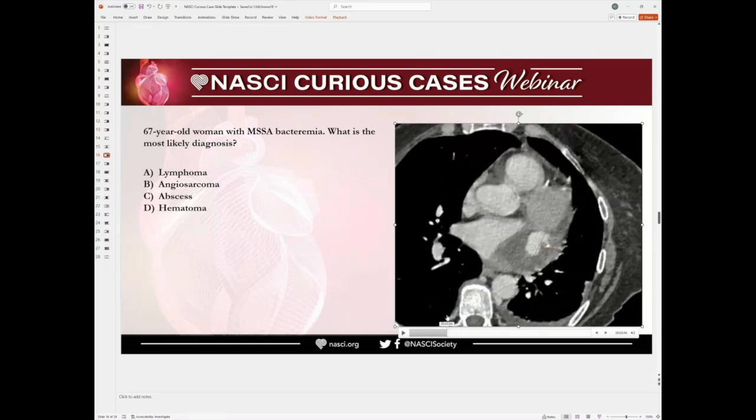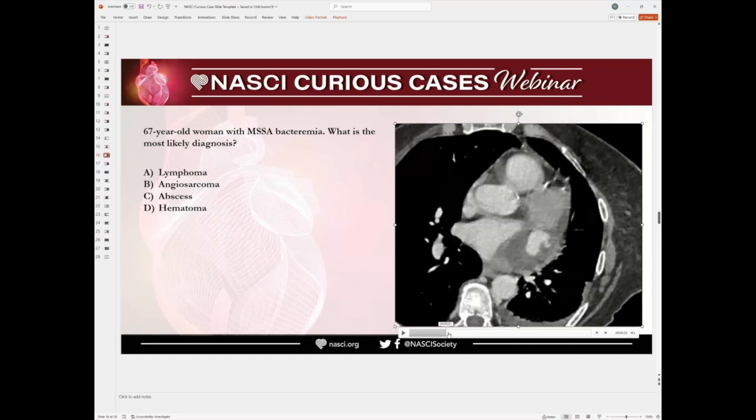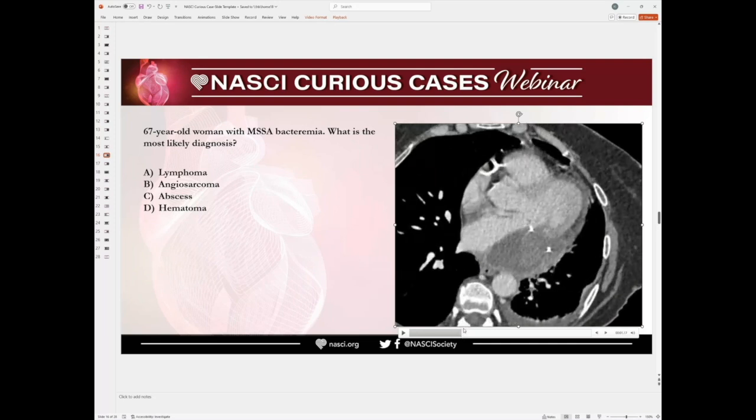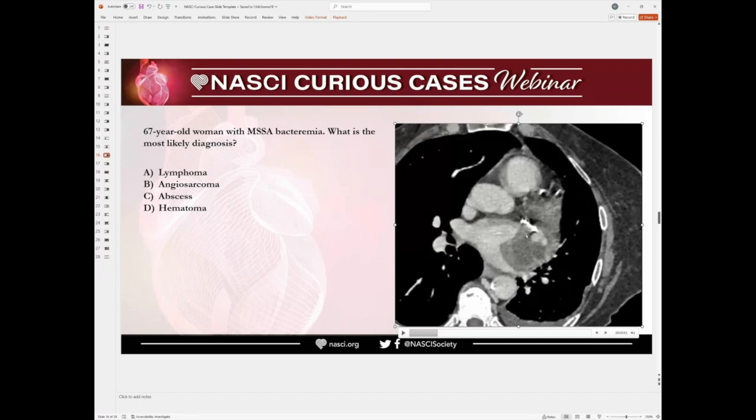Yes, that's a wonderful case. Another thought: if I didn't have the outside image, I would not know this circumflex pseudoaneurysm wasn't there. So this happened because of the abscess. Another consideration, sometimes our cardiologist friends can help us with that. What I read in the literature is that after an invasive catheter angiogram, you may create a pseudoaneurysm that may get infected. But we know that in this case, the pseudoaneurysm happened later on.